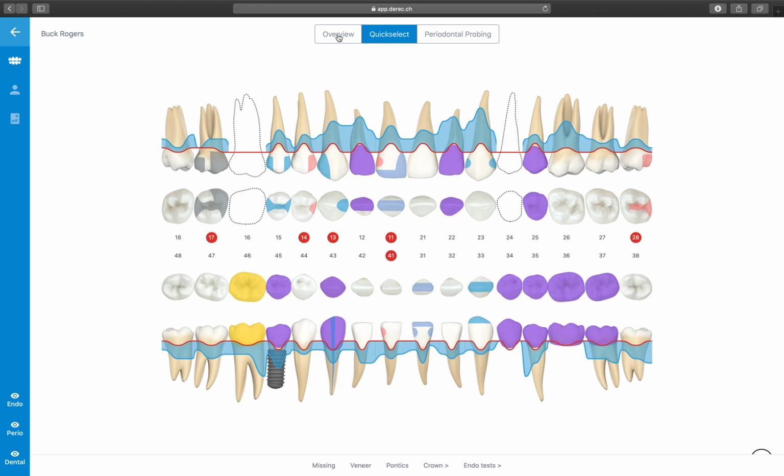In some situations, like an emergency patient in pain, you focus more on a single tooth or a group of teeth that might give the patient pain. Full endodontic diagnostics require mostly three clinical tests: the cold test, for checking the tooth pulp, the percussion test, for testing the periapical tissues, and an X-ray of the tooth under investigation.